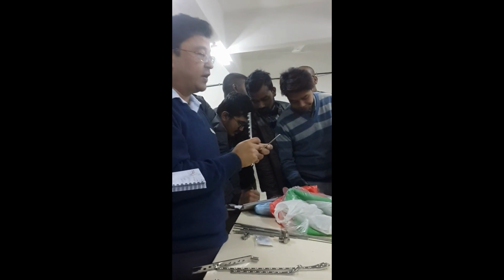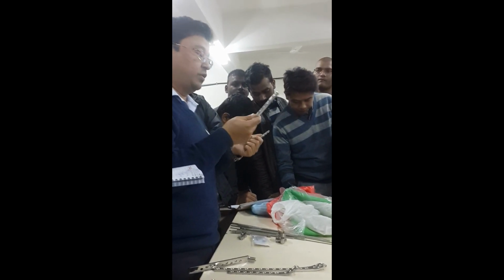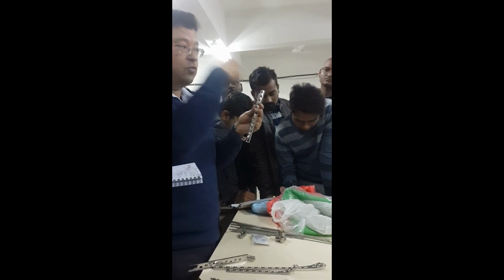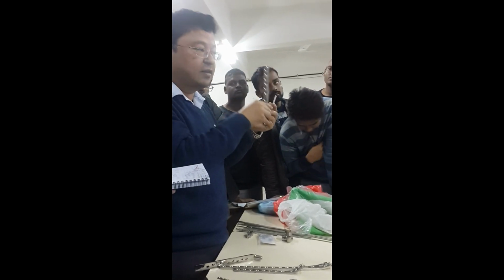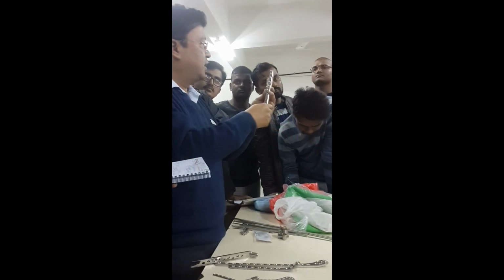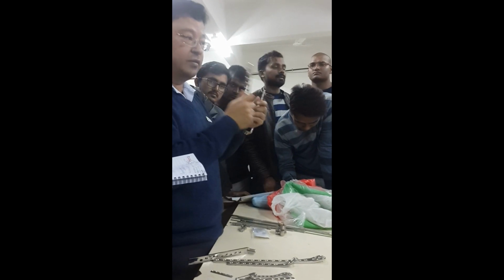So DCP is the 3.5 mm system and the 4.5, which is narrow and broad. Broad means staggered. And what is the advantage of staggered? You can apply screws in different directions. If screws go in one direction, the pull out strength is less. But if one screw is going like this, one like this, one like this, the pull out strength is very much greater.